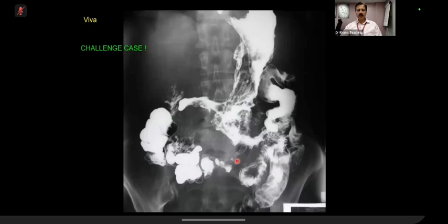This is a classical exam film where you have to ask yourself, is the contrast at the right location for the timing of that film? Now look here, what is happening? This stomach is totally abnormal. This is a linitis type of stomach. It has got mucosal destruction here.